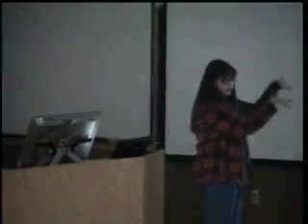So what did I tell y'all about lateral masses? Oh, it's like I Dream of Jeannie. Okay, do you see anything there? On the left side. Yes, on the left side. Right here.